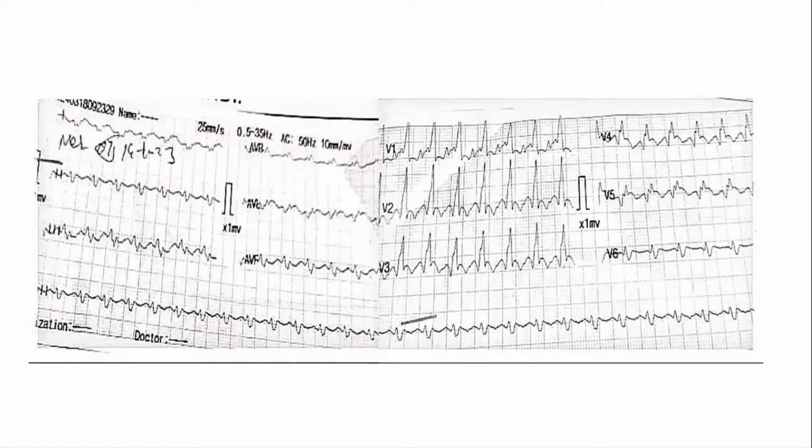Good, you said it rightly, but you have to apply these as well. So, first step, absence of an R wave or S wave: we can see absence of an RS complex in all chest leads. So do you think it's happening over here? Yes, please continue speaking.